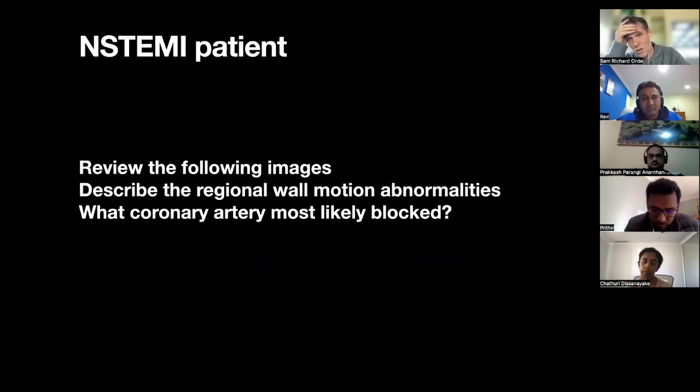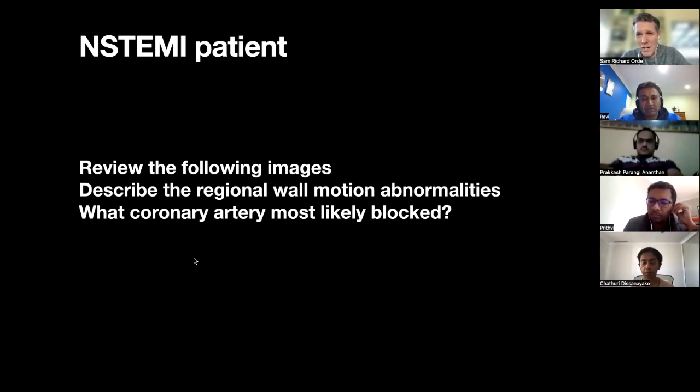And for me, which coronary artery would that be then? Right coronary. Yeah, it could be right coronary, it could be circ. And this would be in keeping with someone who is obviously needing an inpatient angiogram at some stage. Doesn't have to be urgent, but was thinking that this did indeed show signs of some regional wall motion abnormality. So in summary, I think probably getting regional wall pass or fail is going to be a bit tough because there's a huge subjectivity to it.